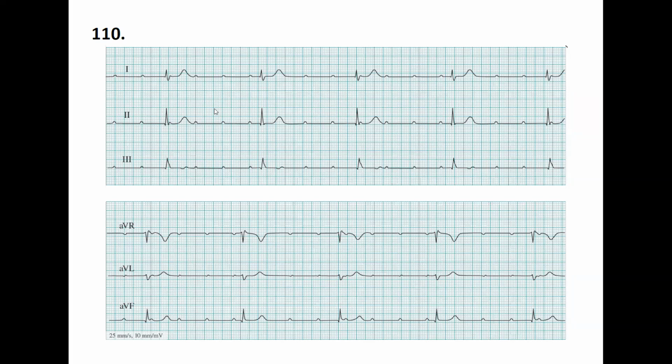It's a very bradycardic one. And another thing that you already had in the lecture, there is no connection between the P and the QRS complex, because sometimes the P is exactly in the middle of the QRS complexes and the PR interval is not constant, so that's a 3rd degree AV block. And plus we do have a junctional rhythm, and this is why we have 30.